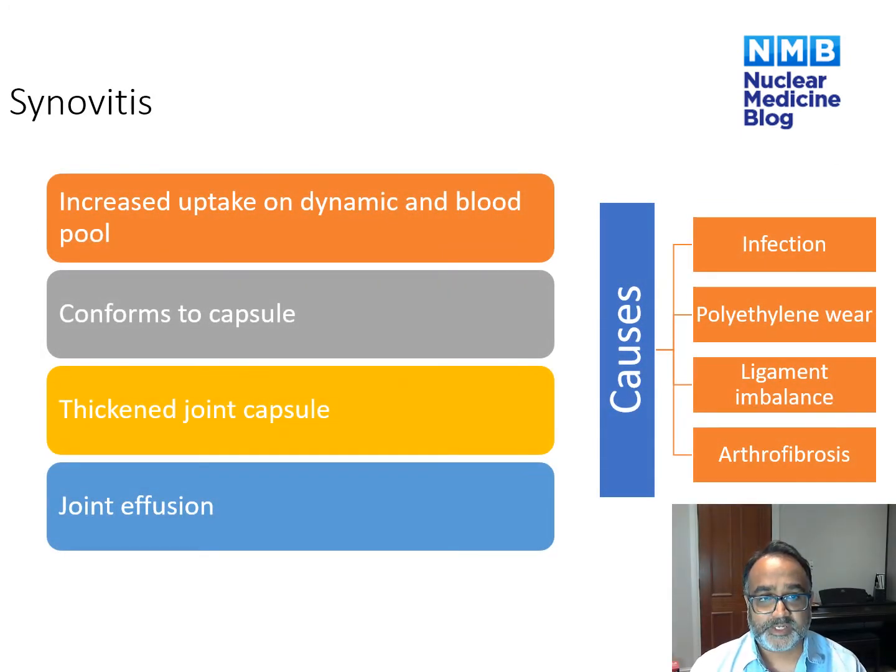So in order to diagnose synovitis, we would like to see increased activity on the dynamic and blood pool phases, which conform to the capsule of the joint. We can sometimes see thickened joint capsule and a joint effusion on the CT.